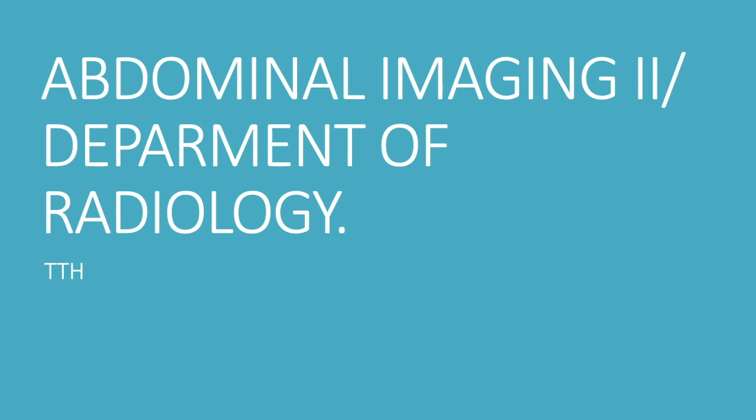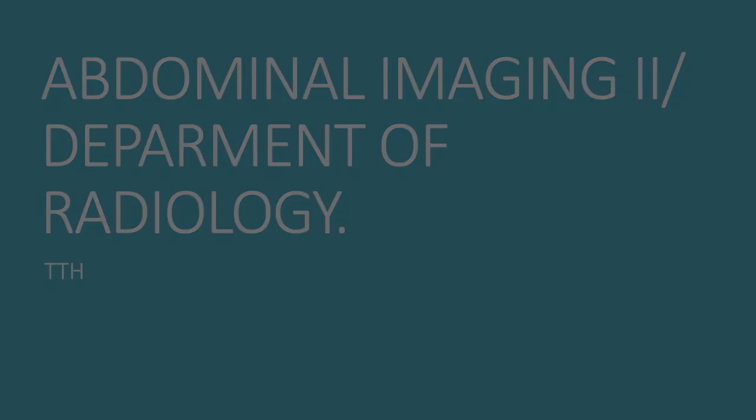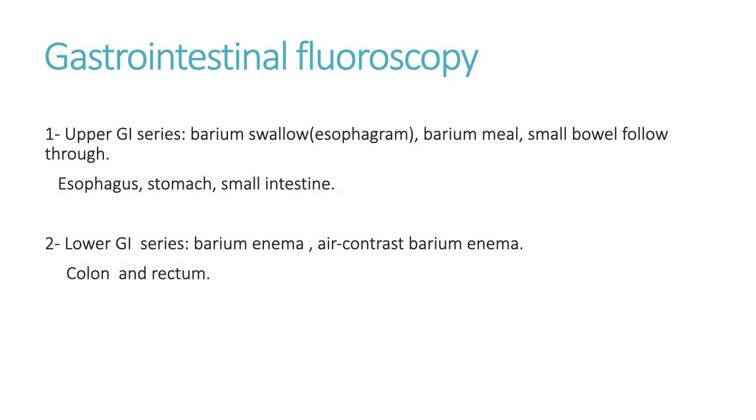Okay, welcome to our second part of our abdominal imaging. Today we are talking about contrast studies. So in gastrointestinal fluoroscopy we have two series of studies. We have upper gastrointestinal series and lower gastrointestinal series.